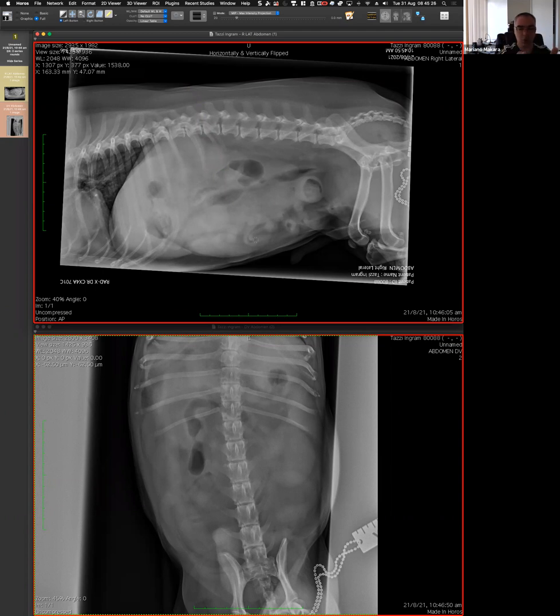Makes sense? If you just go to the problem and focus, then you may miss something important that wasn't in your focus. And again, it's not a criticism, it's just to be aware of your approach. The other is to do the opposite. To say, I don't want to know anything about this case, I just want to look at everything. I'm going to go first to the very uninterested parts. So I'm going to go to the legs, the spine, the thorax. I know this is an abdominal radiograph, so I'm not going to go to the center, and then at the end, you go to the center.